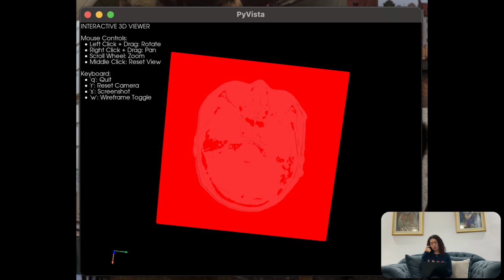And why I'm exploring 3D visualization is because doctors and radiologists reason spatially, not just in 2D. So I wanted to explore whether it's possible to visualize tumor predictions in 3D to give better anatomical context. The first attempt I did involved stacking and extruding a single 2D MRI slice into a 3D volume. This technically gave me a 3D structure as output, but it wasn't really helpful. It was more anatomically incorrect.